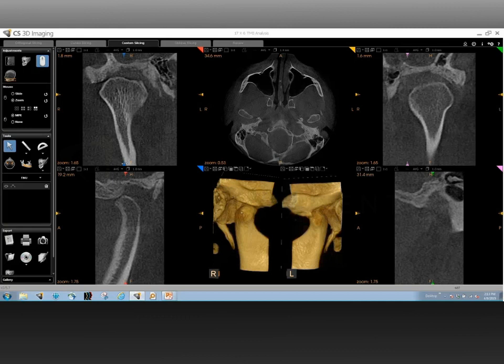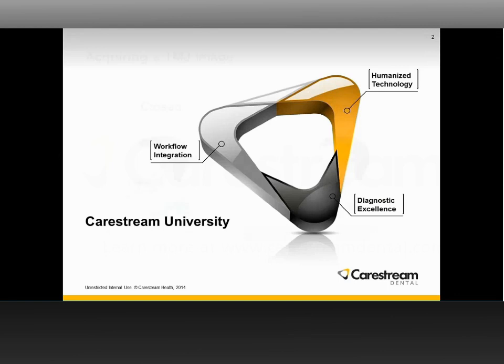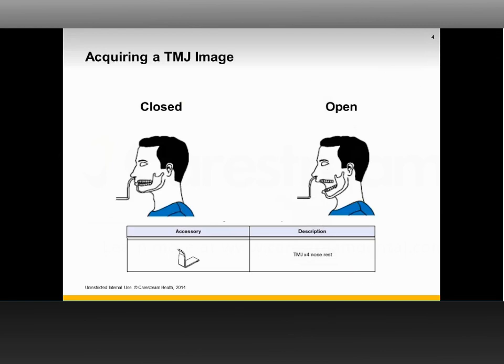Absolutely, and that is one of the big advantages of CBCT. It is possible to do an open view, and one of the reasons an open view is done is to understand the translation of the condyle from the closed position to the open position. One of the big advantages of having a fast scan mode is that you can keep the patient's mouth open for less duration and do a fast scan, thus avoiding other issues, and even patient fatigue between doing two scans. So to answer your question, it is absolutely possible.